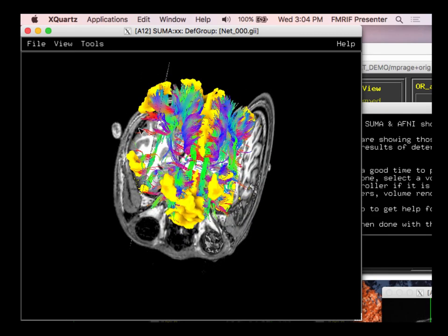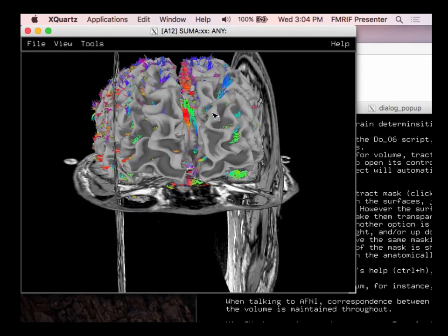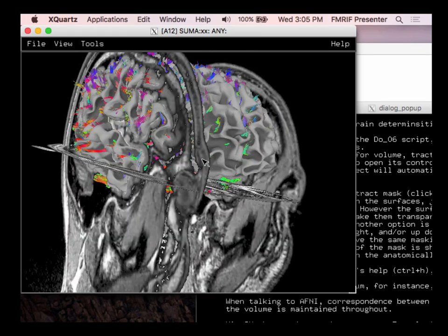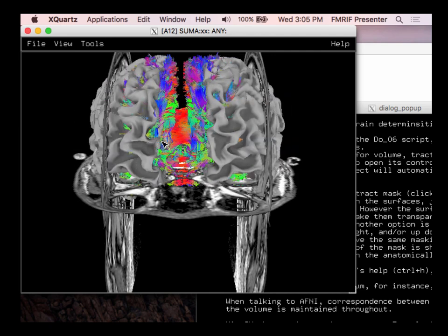And so if I wanted to, okay, I want to enter something through here, not through here where I'm going to run into a particular track, possibly. So these kind of 3D views of combining information are useful. And this is a way now I can combine my structural information of my surface as well as this kind of slice-wise view with the tracks. And I may be interested in opening up the brain and seeing where the tracks are.